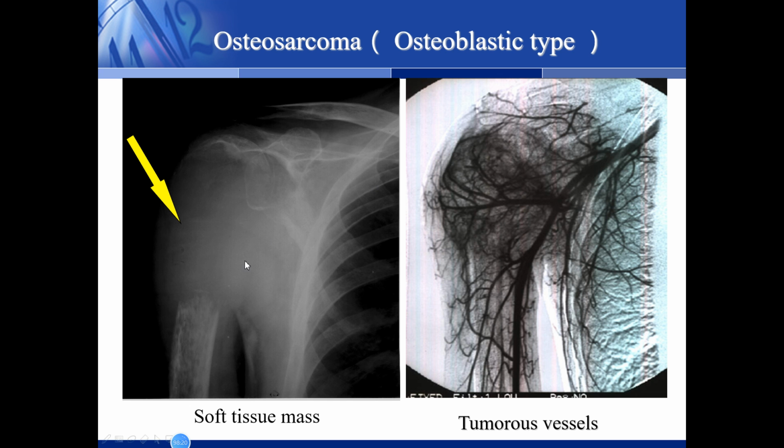and here is the soft tissue. There's a mass formation, and here are the vessels of the mass, the tumor mass.